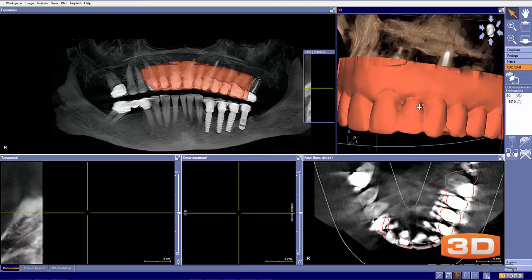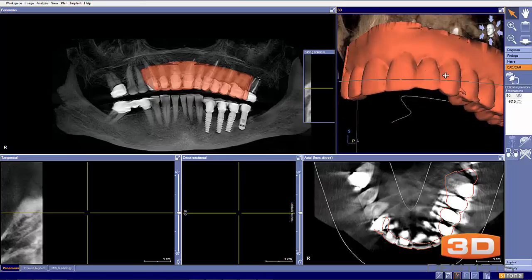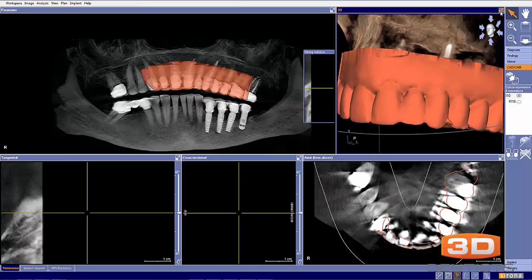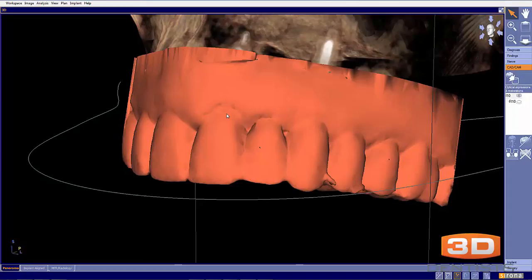Next, what I would like to look at is the CEREC data. Typically with the immediate workflow, what I'm advocating and what we review in the workshop is planning our case like so, planning essentially a veneer on the front of the tooth only, not on the back, just on the front.